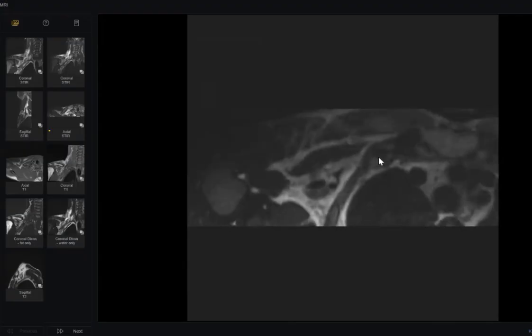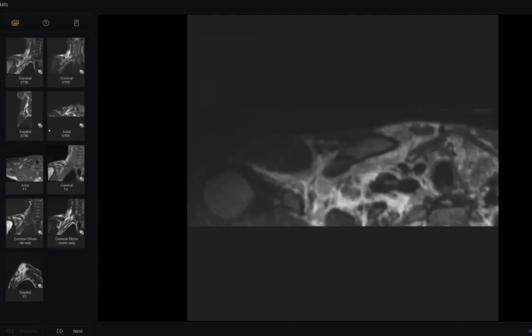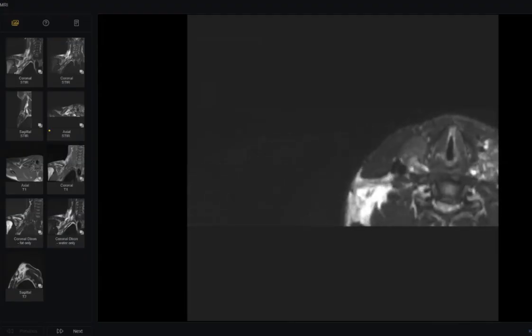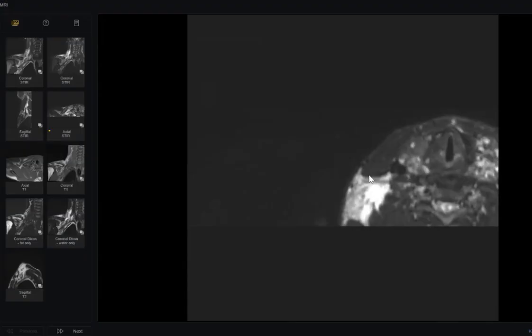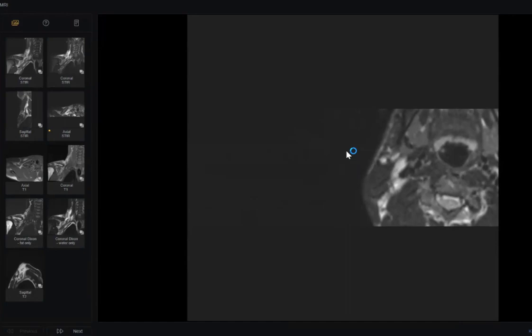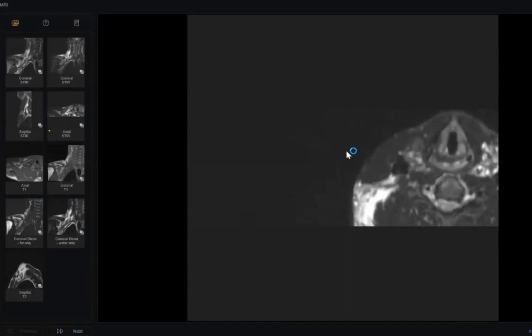After atrophy. What comes to your mind as a post-traumatic cause of fatty atrophy? Look here. There is no muscle here. Only muscle atrophy with fatty replacement. Why does it happen after trauma? What is the trigger in your mind? Something injured.